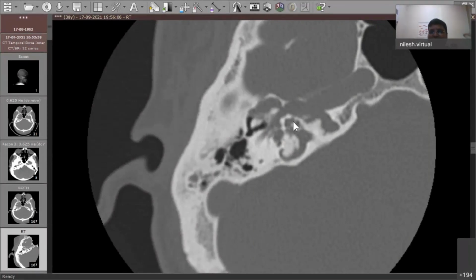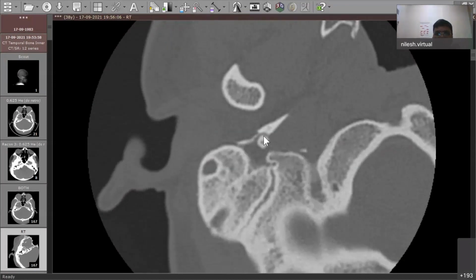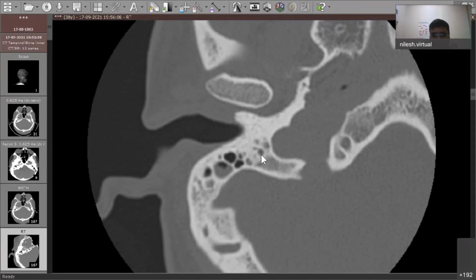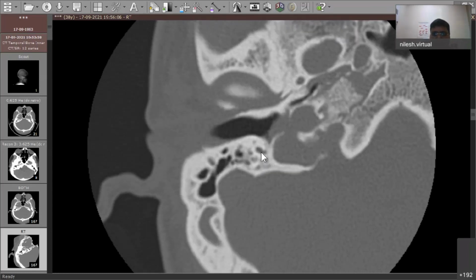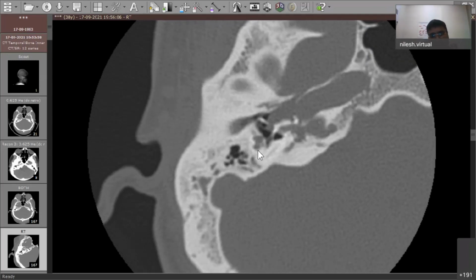You go and find the distal end from where you can trace the facial nerve. So go down in the scan, styloid process, styloid base. Somewhere you will get the stylomastoid foramen. So come up. Yes, this is the stylomastoid foramen. Looks normal. Come up, still looks normal. The vertical segment looks normal. This is also normal. Looks normal.